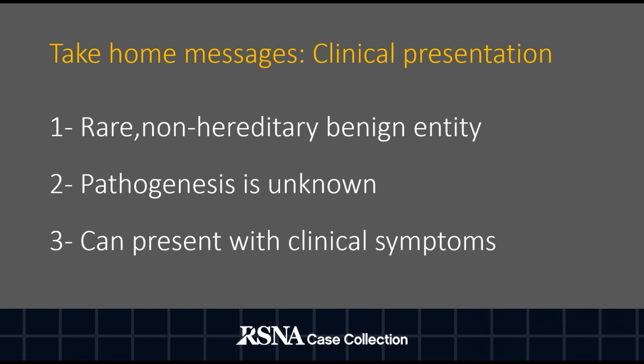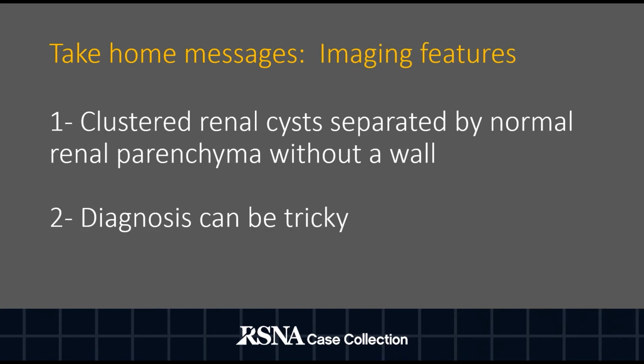In some patients, the lesion is incidental. In others, they may present with hematuria, flank pain, palpable mass, proteinuria, renal stone formation, or UTI. Imaging features involve identification of clustered renal cysts separated by normal renal parenchyma without a wall. The absence of a wall or capsule allows the normal renal parenchyma to insinuate itself between the individual cysts.